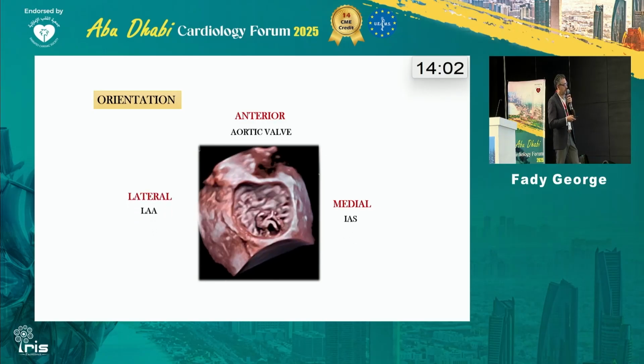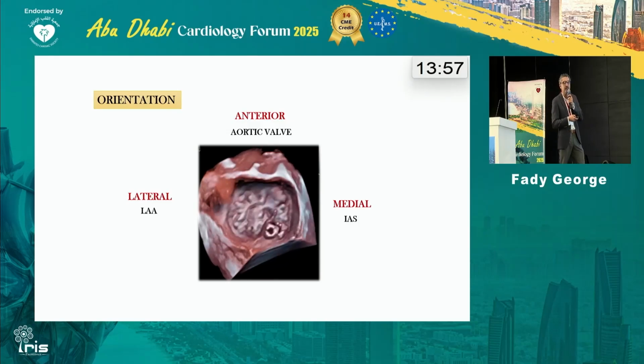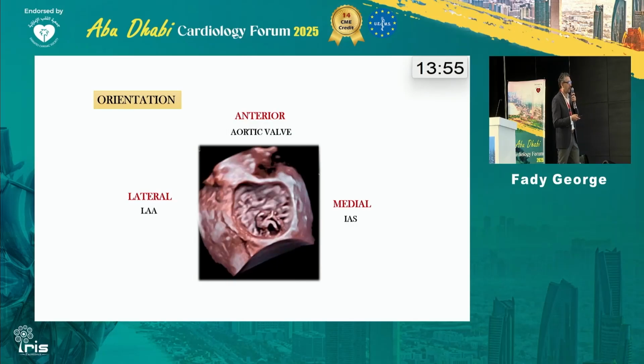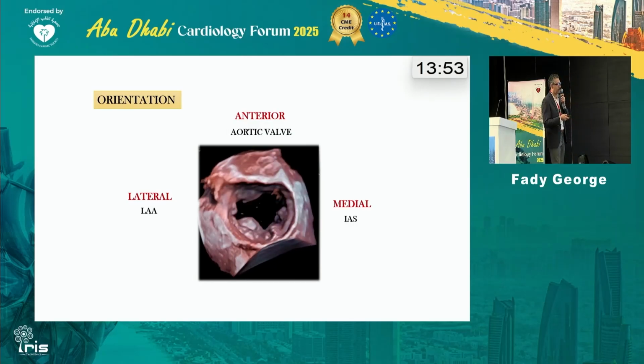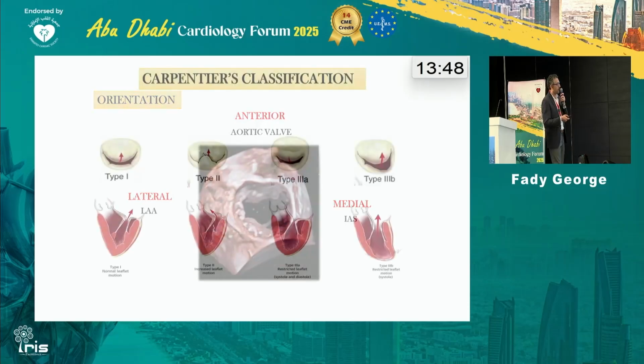What do you see here? The same that we've seen in the other one, but this is like a photorealistic photo of the 3D image. It's more advanced. You can see clearly the prolapsed valve and the flail, and the chordae tendineae rupture as well.